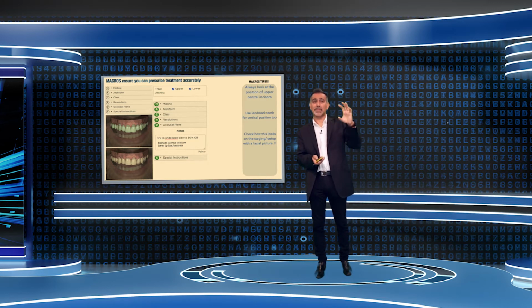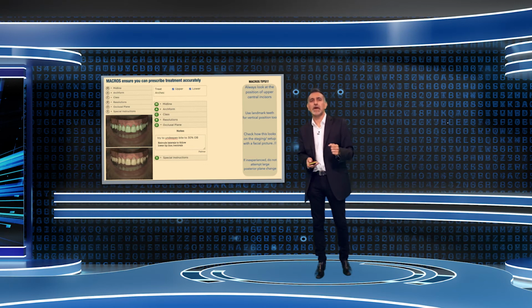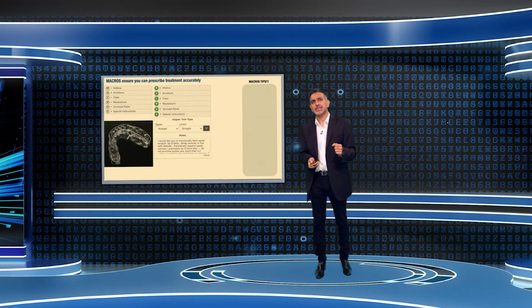They've moved the laterals and they moved the canines a little bit, but I haven't changed the centrals because I said, hold those landmark teeth. And as mentioned, you can check that within the facial picture as well. And again, if you have limited experience, probably not best to do a lot of large posterior changes as well.